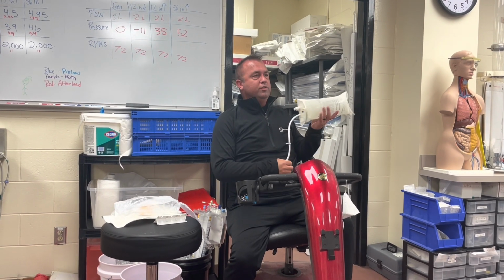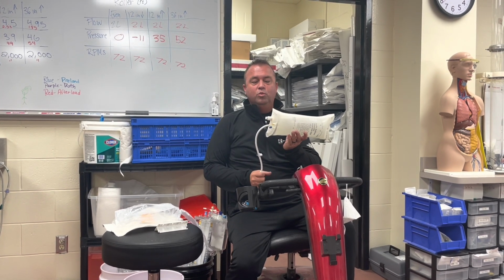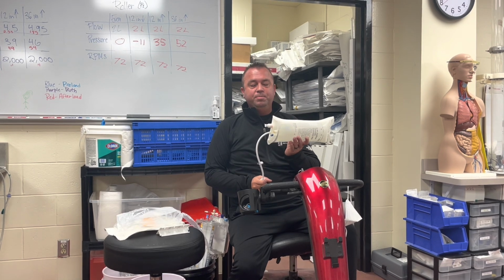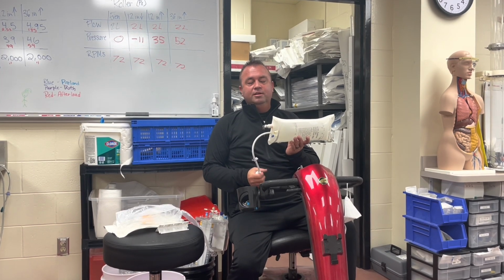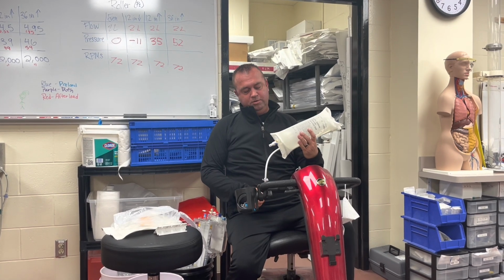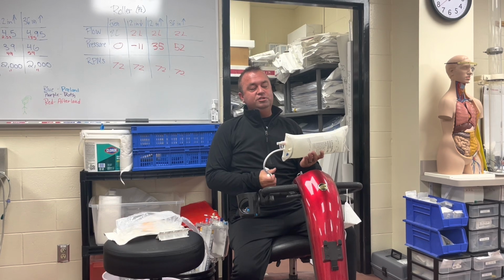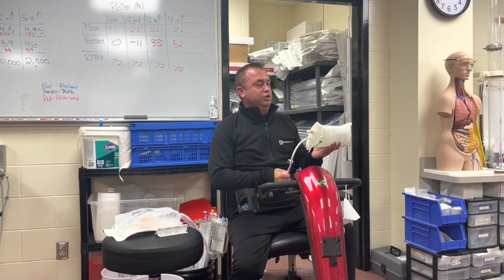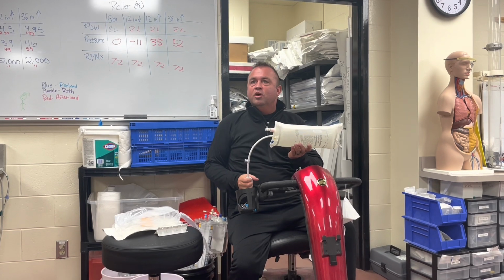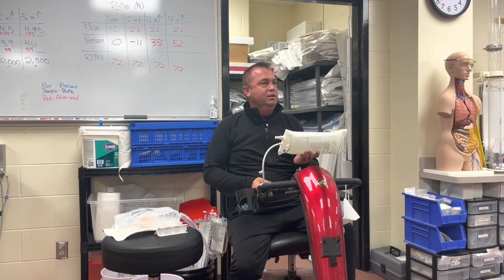Now, one of the cool parts about these bags, they make it very foolproof. Watch what happens. Keep pumping, keep pumping. Look, it's labeled on there, 150, 200. All at once, we get into green. It goes from white to green. Wow. Why would they do that? That's probably 300. So you don't make it explode?